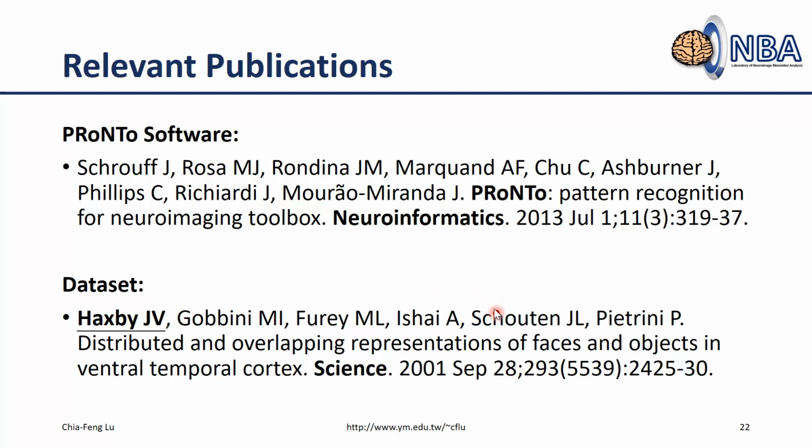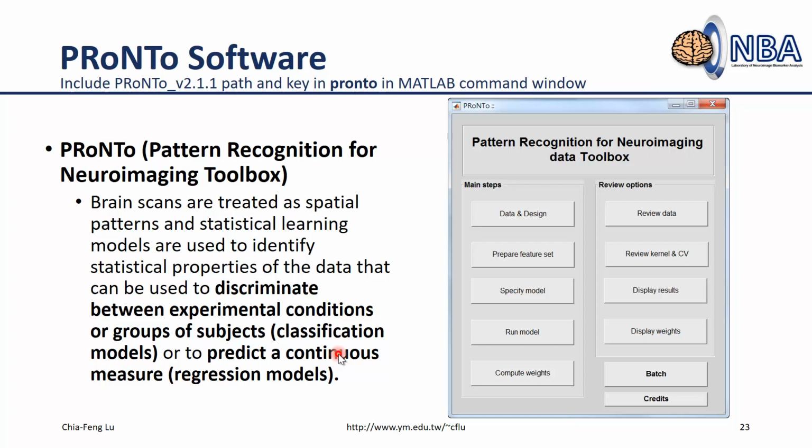It's also a very important point why I picked PRoNTo, because this is the only software or toolbox that also provides this dataset for you to practice or to learn how to use this kind of environment. I like this one because in our first part we also introduced this paper. So I think it's a very good starting point for you.